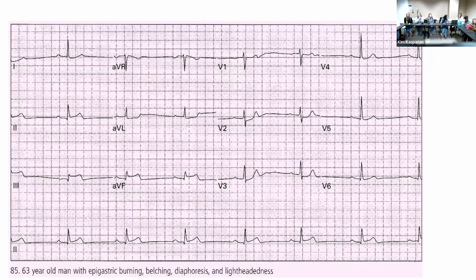V2, V3 are sus. AVF also. Any others? Yeah, and V1 looks like it. It's remarkably hard to find really good quality scans of EKGs on the internet.